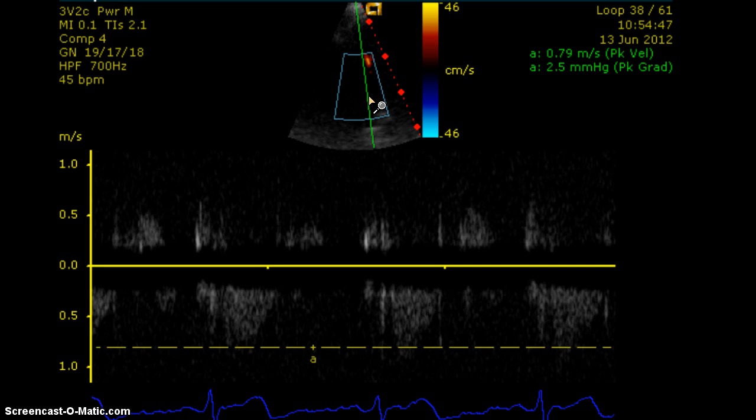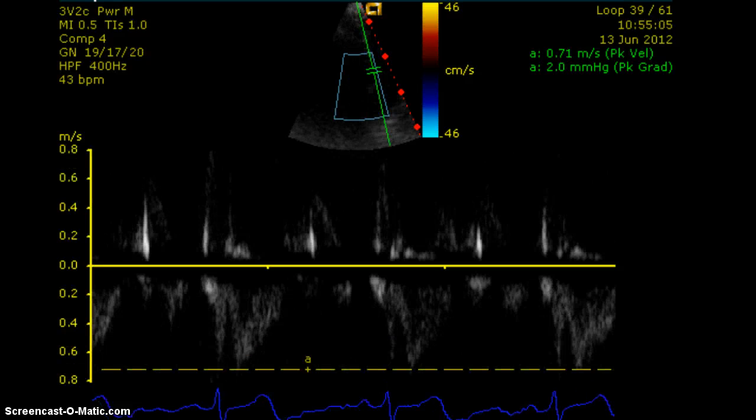So it was a very poor suboptimal image, and the image itself should probably have been corrected and tweaked before placing Doppler. And then again, this is the V1 LVOT. The Doppler looks pretty, but the caliper is floating, not placed in the correct location. And again, the image is very unclear as to exactly where you are. Is this a 4-chamber, a 2-chamber, a 3-chamber?